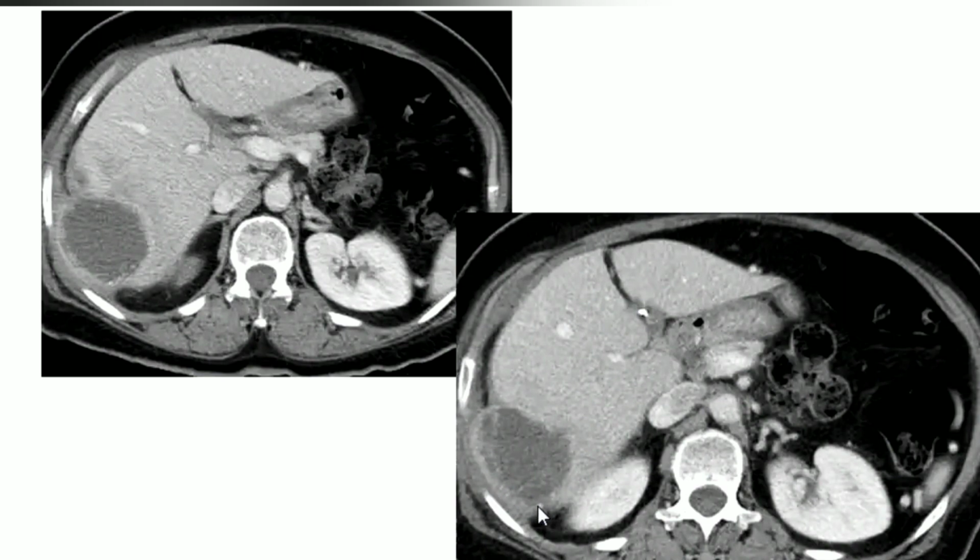What do you think regarding these hyperdense foci, tiny hyperdense foci? Hello? Ma'am, I got muted. Sorry.